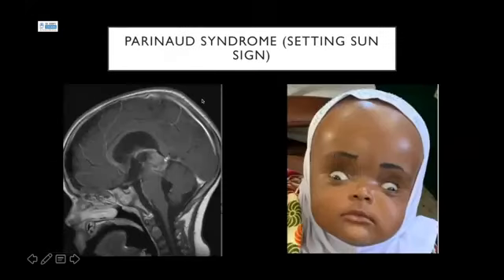So the pineal gland is clinically relevant. So this is a sagittal T1 post-contrast weighted imaging showing a mass in the region of the pineal gland. And in this case, it is a pineal germinoma. So it is compressing the tectal plate. And subsequently, there's CSF, which flows between the third ventricle here and the fourth ventricle here through the cerebral aqueduct. This mass is compressing this route or this flow of CSF and is causing upstream obstructive hydrocephalus.